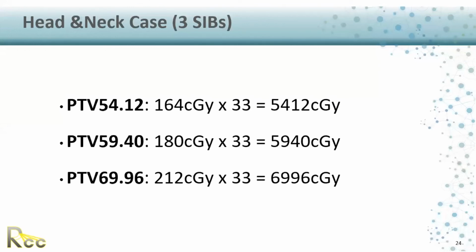So we prefer that you use the high dose rate, especially for SRS. The 6FFF from Varian is capable of delivering 1,400 MU per minute, and the 10FFF is 2,400 MU per minute. So it depends on the site you are treating. I treated a spine patient a few weeks back, 21 gray, one shot.